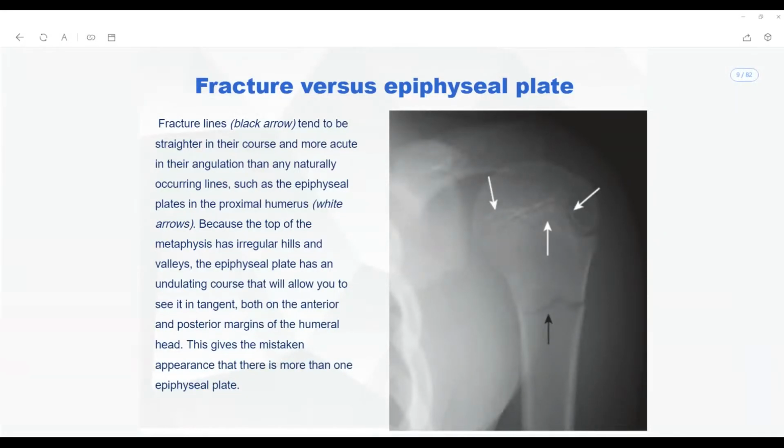So Debelina, were you able to make this analysis, or did you just choose from two options, complete or incomplete fracture? All the people who answered incomplete fracture, you are not looking at the x-ray closely, and you are forgetting the rule. The rule of x-rays is that you have to look at two different views. Nobody even asked me, sir, how does it look on the lateral side? You are trying to reach a conclusion based on just this one view. So don't make that kind of mistake.